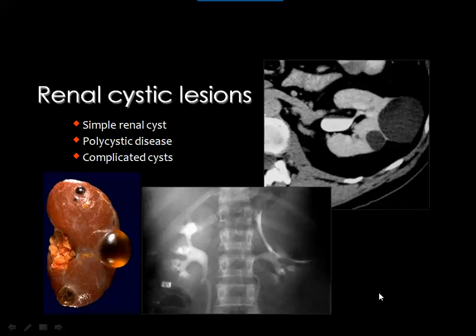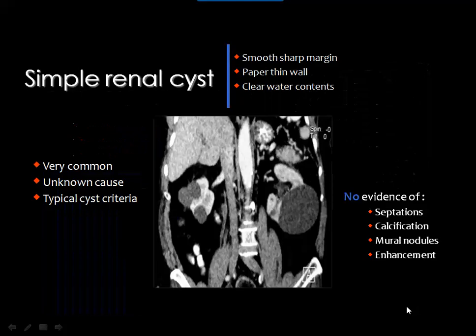And they taught us that for diagnosis of simple renal cyst on intravenous urography, you can see this finding, which is a stretching and displacing of the calyces, meaning that the lesion here is benign. But ultrasound is very good to show the cyst, and also CT is very good to show the cysts, which may be multiple and bilateral.